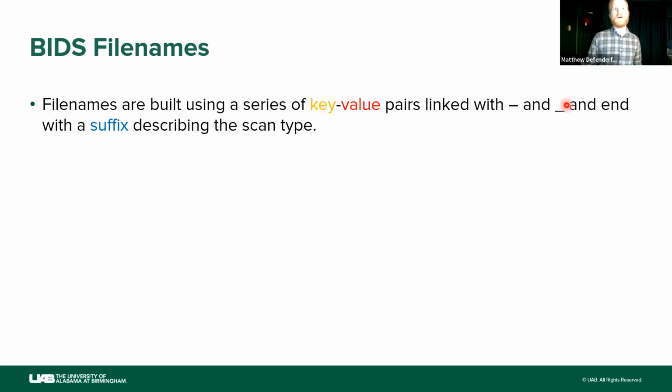So if your subject identifiers have hyphens or underscores in them, during the conversion, those are going to be removed, just so you all know about that. We had a little issue with that previously, but it got worked out. So just so you know, those are going to be removed from any subject names or anything like that whenever you are converting.